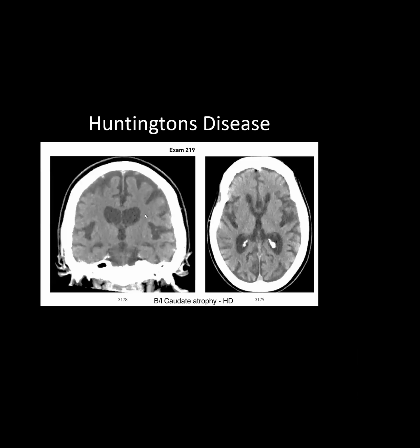And I think this is an example of Huntington's from your in-service where it showed this kind of ballooned out frontal horns and kind of small caudates.